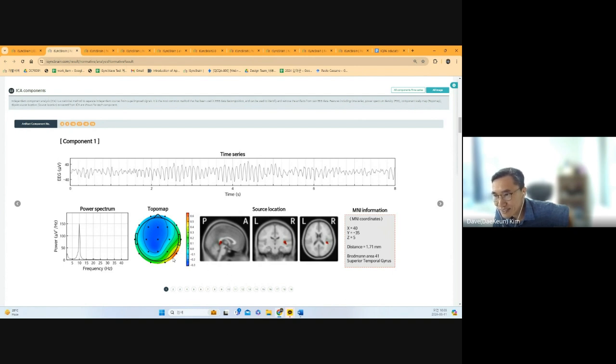In this case, T6 has the largest alpha activity. Usually, the largest T6 alpha is the biomarker for emotional trauma. So you can see the T6 alpha in the spectra. Usually, this is an eyes closed recording. Usually, the highest alpha activity should be in O1, O2, but in this case, T6 alpha is the highest amplitude. That means the emotion perception area is not working. So that's the very famous EEG biomarker of emotional trauma.